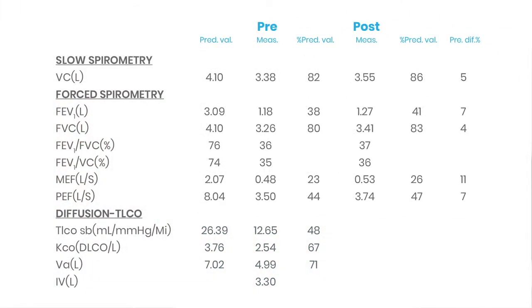And so here we have the results. Once again, the numbers are in a different order to what we're used to. They're represented slightly differently from the first case because they've come from a different program or from a different respiratory lab. However, if we go by exactly the same process as we did in the first case, we can interpret these results quite simply by just knowing the more important numbers to look at.